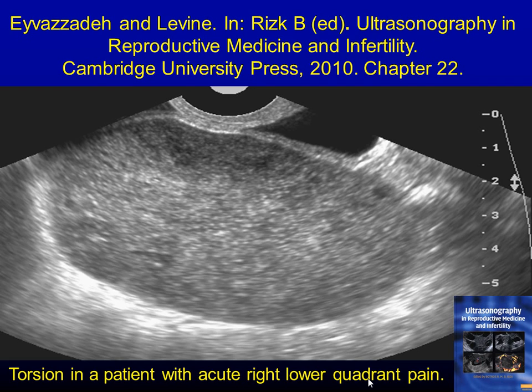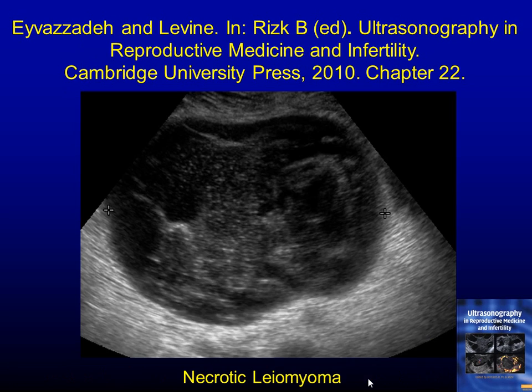Yes, exactly. Ovarian torsion. So this is ovarian torsion, and it is mottled. And if you do Doppler, usually you get low blood flow. But yeah, exactly right. So even one day in REI and you're okay. So this one, severe pain also. This is a necrotic fibroid.